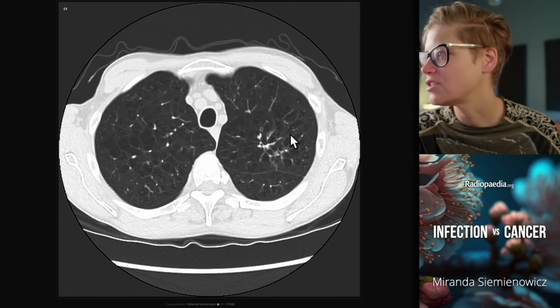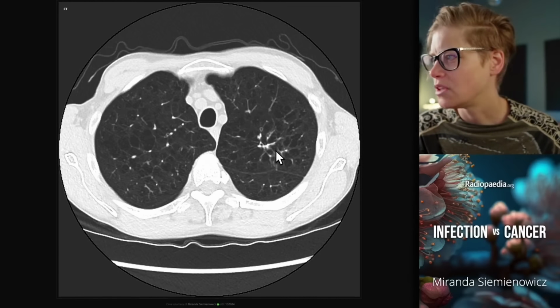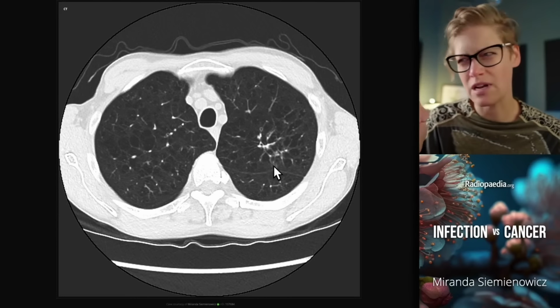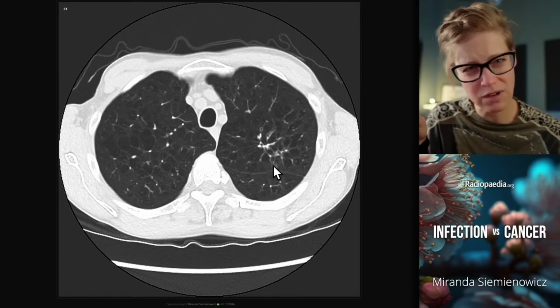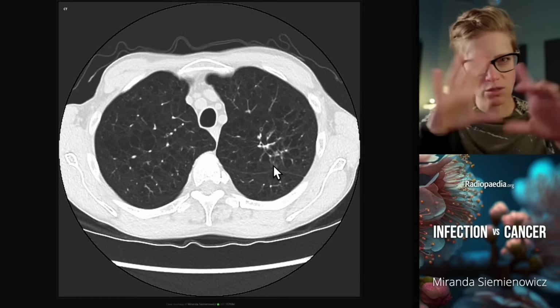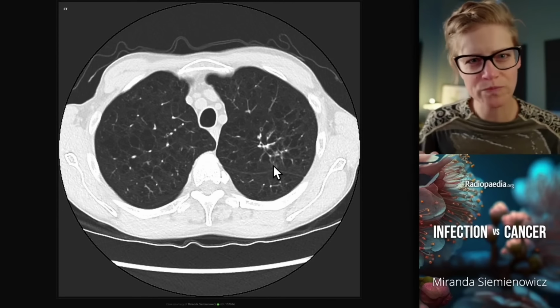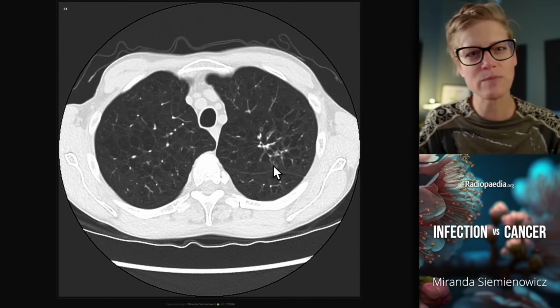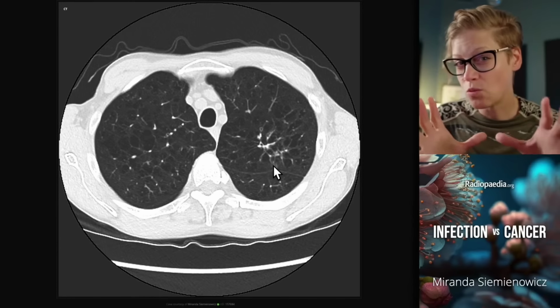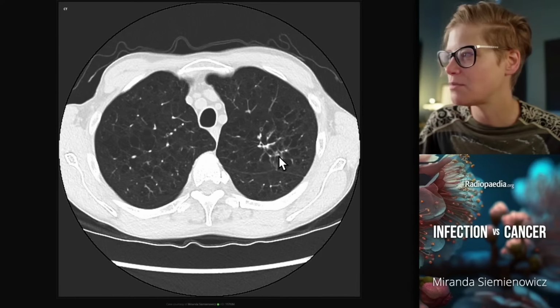Here we have a cluster of secondary pulmonary lobules. So this is a lobule, this is a lobule. They are not beautiful and polygonal. They're a little rounded out. They're a little smaller than that 1 to 2.5 centimeter size that we expect to see, because the air spaces that comprise those secondary pulmonary lobules are abnormal. So those alveolar spaces are coalescent, and that distorts that normal polygonal expected appearance that we see. But this is a septum, this is a septum, this is a septum.